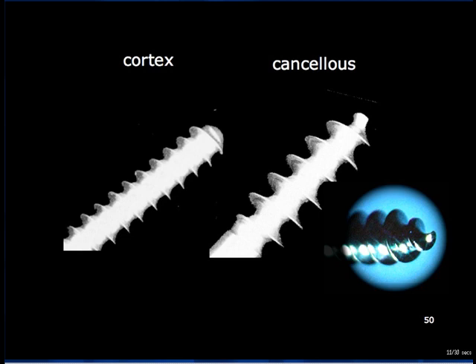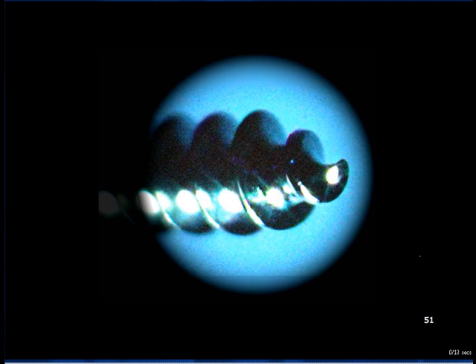Note that the spiral of the helix increases from a point at the tip to the full thread diameter over 2 complete turns. Those cancellous screws that are not fully threaded have a smooth shaft. The head design is similar to that of the equivalent cortical screw. Cancellous screws create their own thread not by removing bone, but by impacting it aside, rather as a snow plough creates a path through the snow. The tip design achieves this.